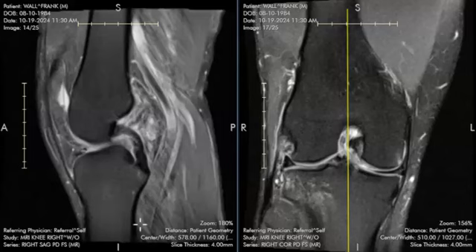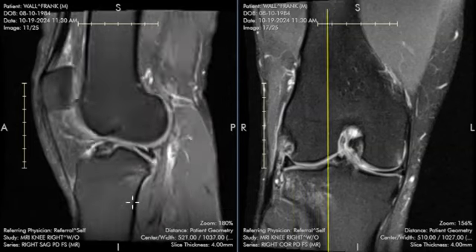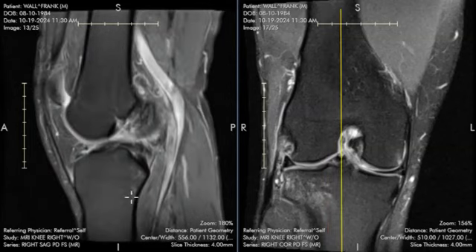Hello, Mr. Wall. My name is Dr. Gianni. I'm the radiologist who's reading your MRI of the knee. I'm going to walk you through the findings in my report, and as I do that, I'm going to scroll through the images so that you can get a visual with what I'm describing.